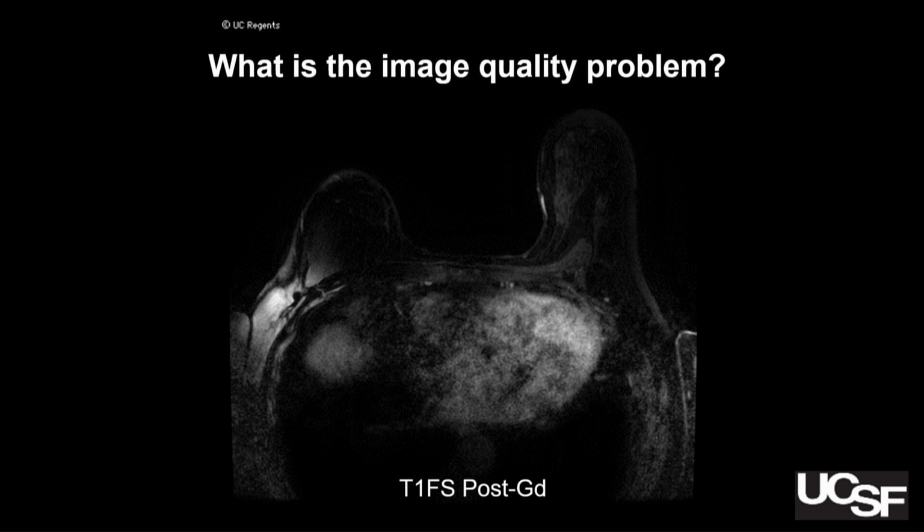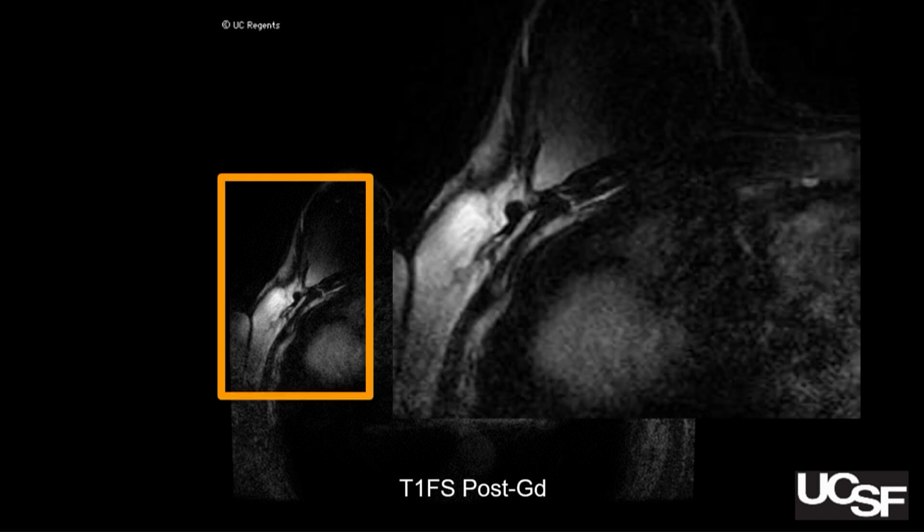While you guys are digesting this image, there's a problem. Those of you who've attended my lectures in the past know that I am a stickler for when tissue goes black. So that's what you're looking for. Most people can see the inhomogeneity, right? There's a bright patch of fat right there. This is a photographic enlargement to focus your attention. So question for yourselves, is there black tissue? I hope you say yes.